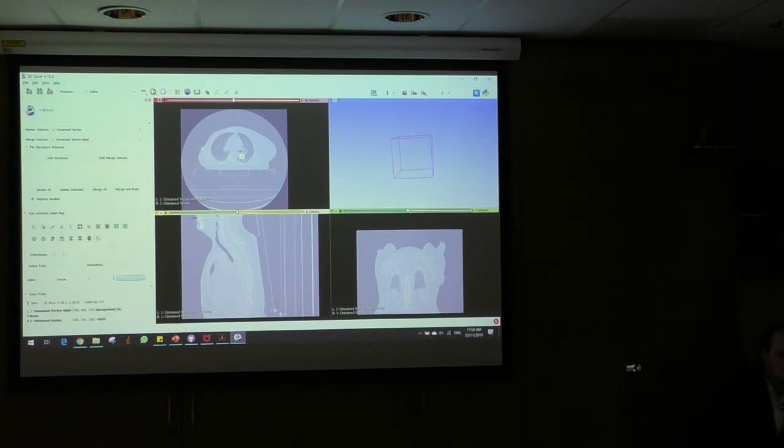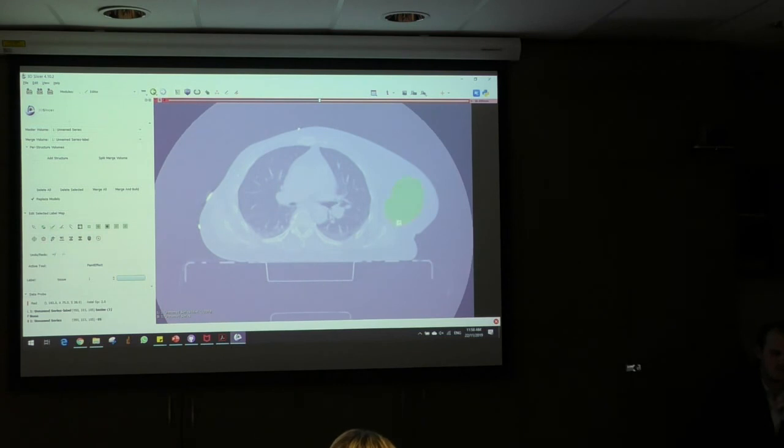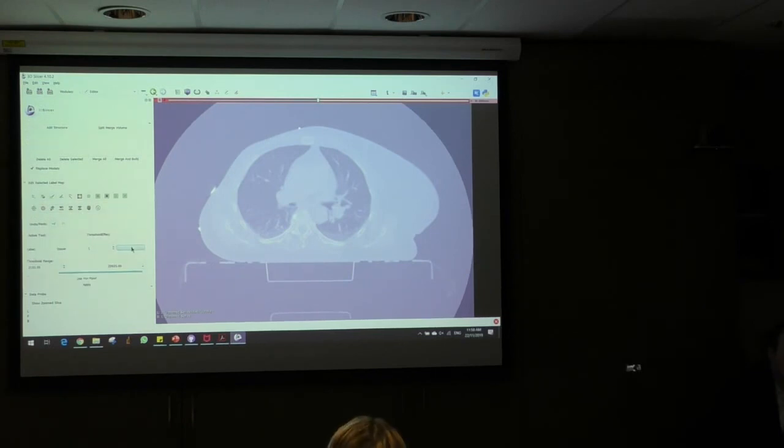So, for instance, the paint effect that a lot of people might be very used to. This one really just allows us to select the region like so, and we zoom up to the next slice, do it again. Very similar to your treatment planning software. We will remove these because there's a little bit of a nicer feature to use, which is a bit easier as well. And that one is actually called the threshold effect. So this is very unique to Slicer.